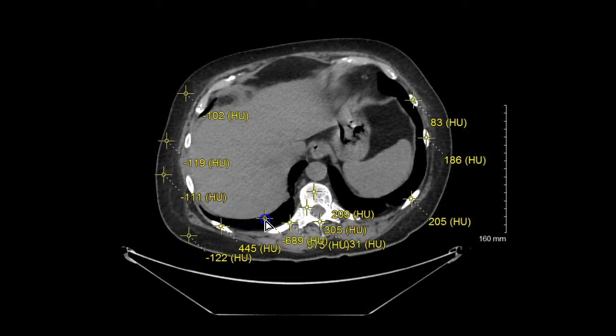I'm going to drag this around that way, since there's a lot of points currently placed, so you can see this a little bit better. You can see roughly negative 750 to 800. There are some points that are even lower than 800, of course, but I just saw one that was right around the 600 range as well. Nonetheless, you can see where those points are associated. I'll throw one down for good measure so you can visualize that. Negative 808, and then we'll look at one structure point here, almost negative 800 as well within that structure.